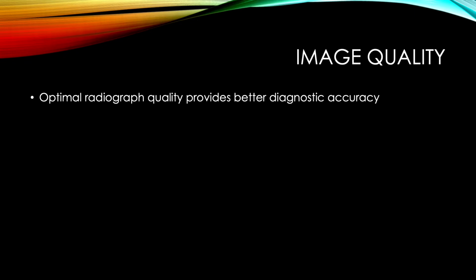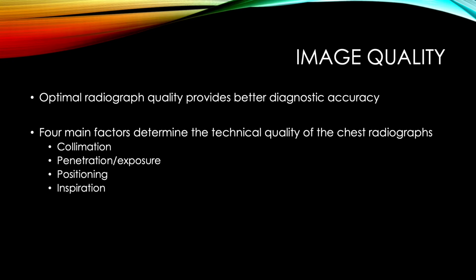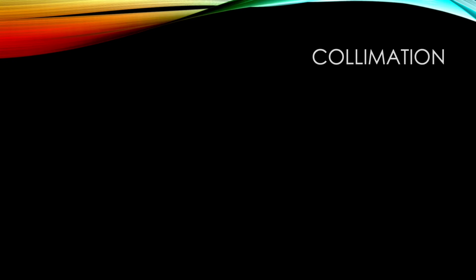Optimal radiograph quality provides better diagnostic accuracy. There are four main factors that determine the technical quality of the chest radiographs, which include collimation, penetration or exposure, the patient's position, and the inspiratory effort. Let's go into details one by one.